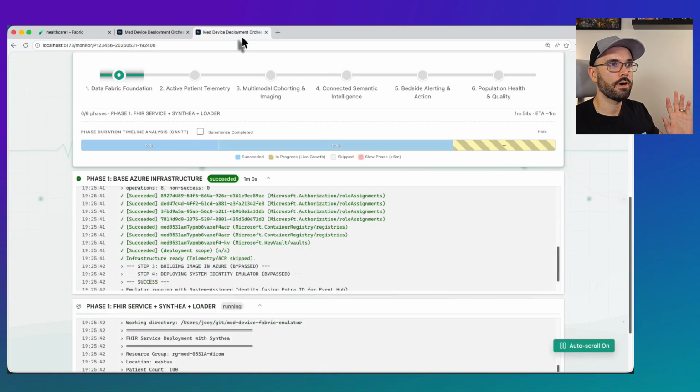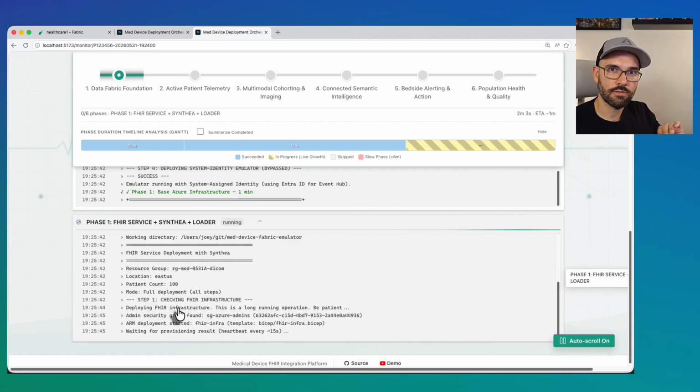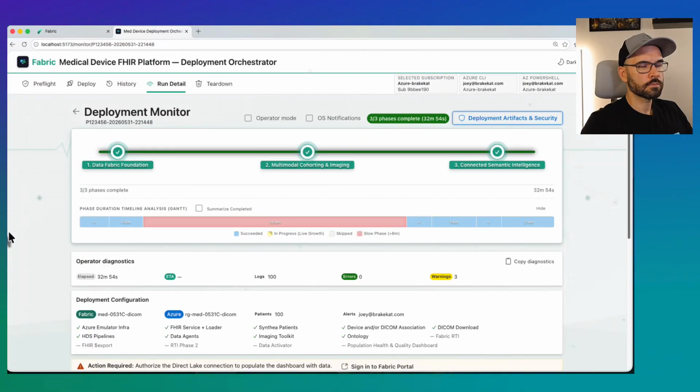We can go back to our Monitor tab, see what's been done already. We're starting to deploy our synthetic patients and a FHIR service. The FHIR service emulates Epic or an EHR of your choice. And that's the process we're on right now. So I'm going to pause the video real fast.